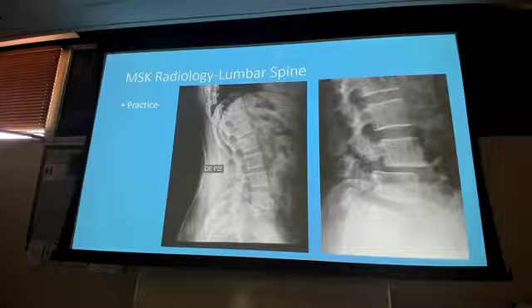Yes, sir? Is that also degenerative disc in the thoracic region? Like here? Right here? Yeah, I see some osteophytes there. I'd buy some possible degenerative disc disease in the lower thoracic. Yeah, same thing. That's why I got distracted.